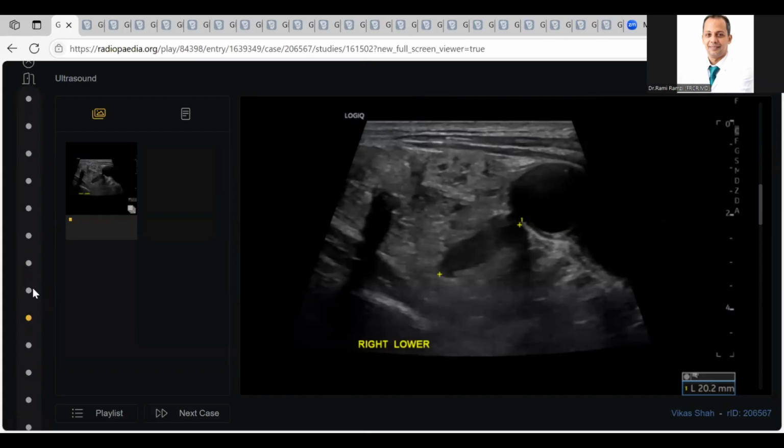Other than the radioisotopic scan, what should you do for this patient? What's the common association for pancreatic islet tumors? MEN syndrome. Excellent. So what other investigation should be done? I would like to do a parathyroid ultrasound to rule out parathyroid adenoma.